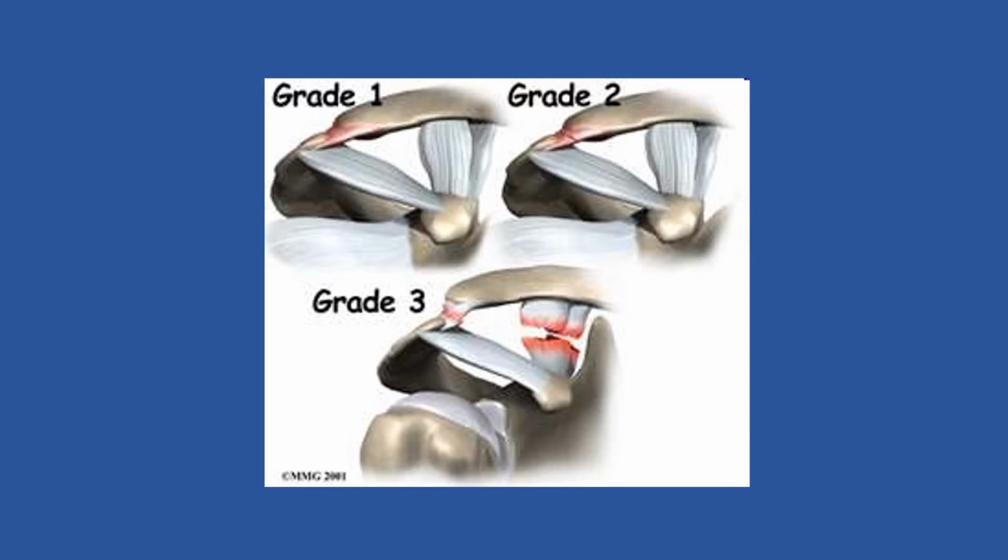And depending on how much stretch there's been on that AC joint, the treatment for a shoulder separation will be pretty substantially different. So again, a dislocation is going to be a dislocation of this joint down here, the GH joint, the glenohumeral joint. The AC joint up here is sometimes displaced.